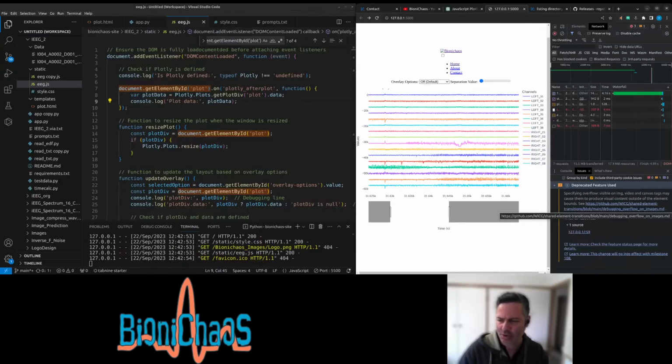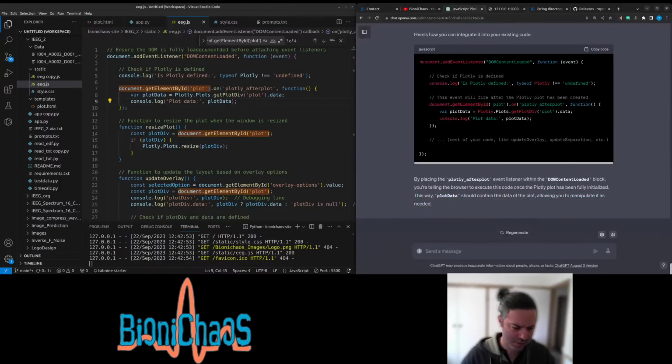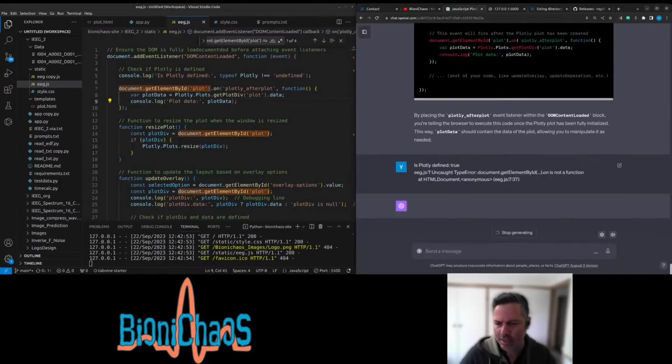It's got the debugging overflow on the images. Yeah, whatever. Doesn't seem relevant. This one.